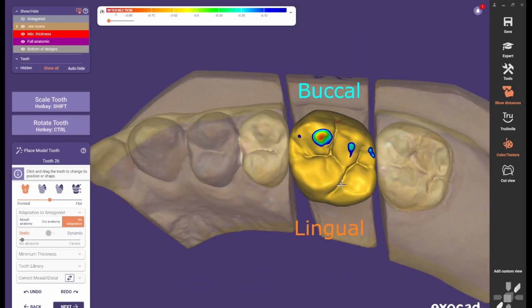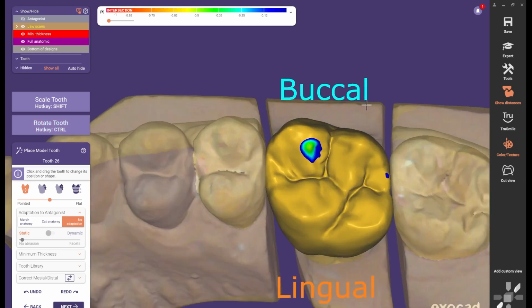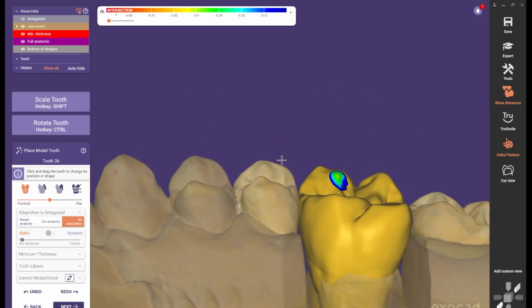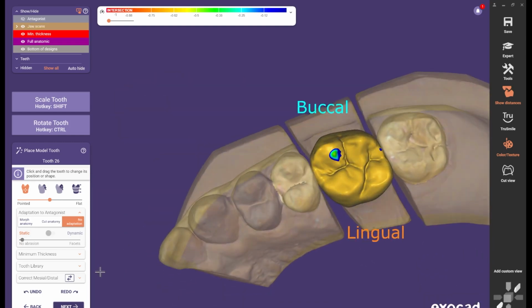Yep. Basically what you wanna do here, if you're not really good with the freeforming, you just have to try to keep the tooth shape as intact as possible. Also, always look at these V's to be symmetrical here in between the teeth. And then you're gonna look at the cusps, tips, so you have a straight line down. This one is way too long, so we're gonna deal with that later in the next step.